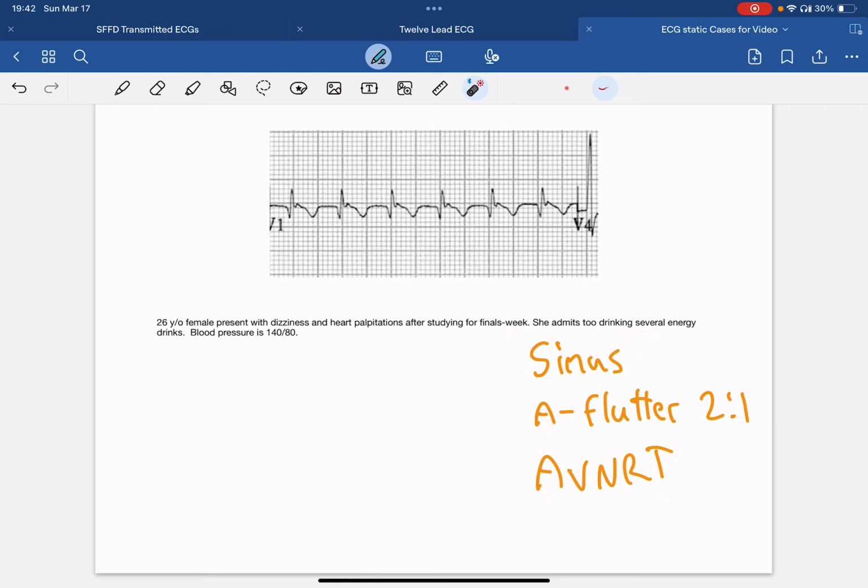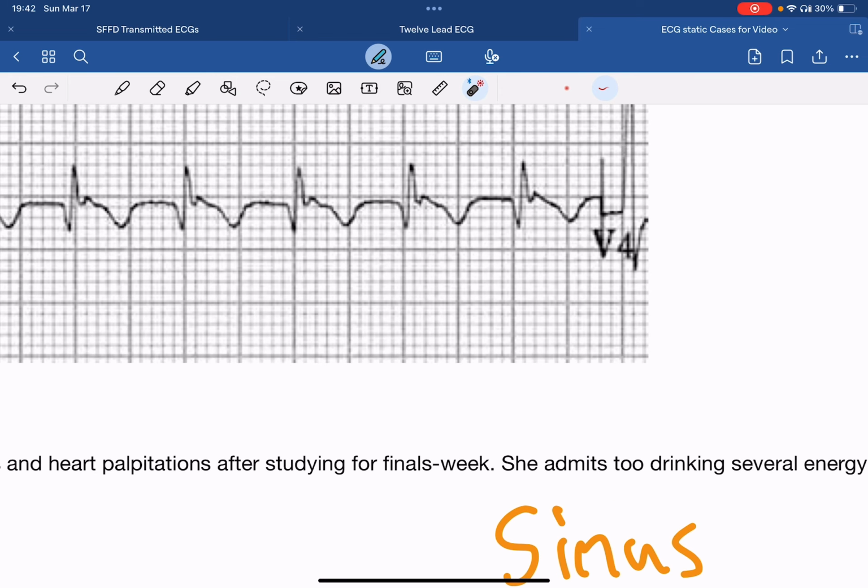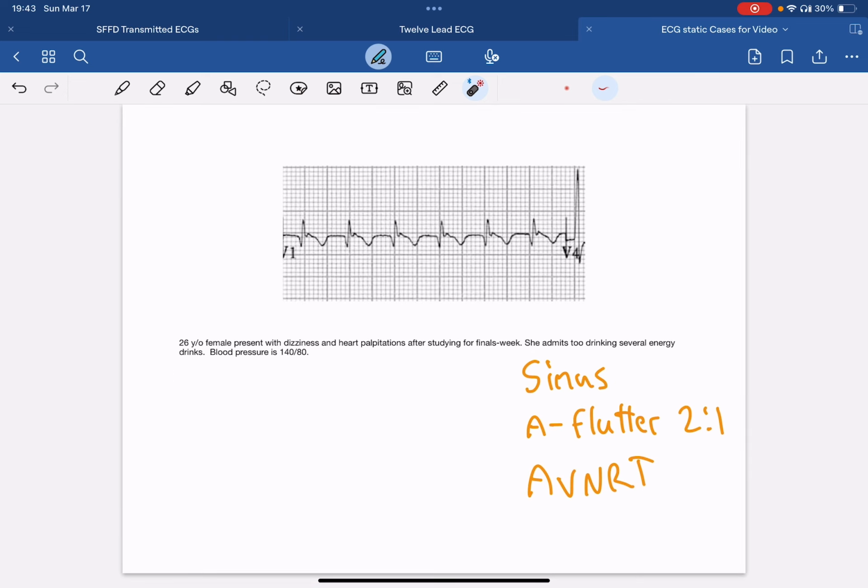So when we're thinking about whether or not this is sinus tachycardia, in order for something to be a sinus tachycardia, we need to have pretty regular P wave activity preceding each QRS complex. So for each QRS complex, we'd expect to see a P wave occurring at fairly regular intervals right here. And we don't see that. We do, however, see this right here, and that is in fact a P wave. However, we know it's not a sinus-produced P wave, in the sense that this is a sinus rhythm, because the distance is way too far for the rate. So we can take sinus and cross that out. It's not going to be a sinus rhythm.